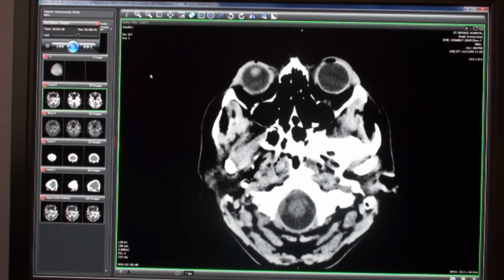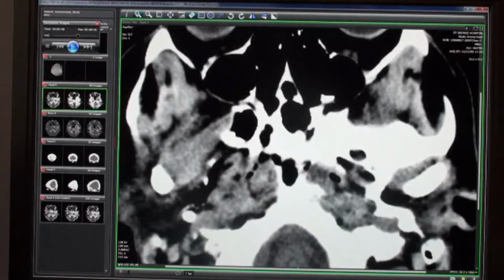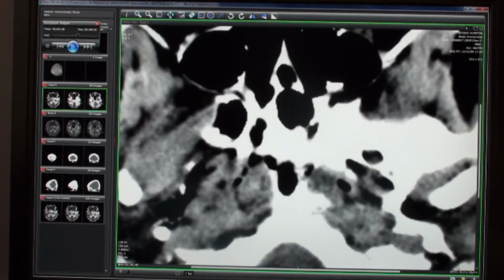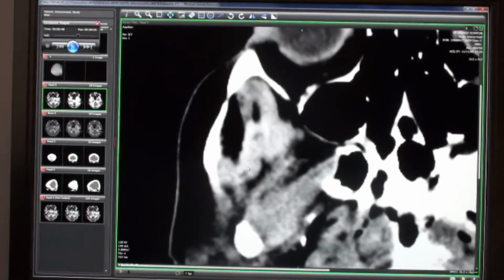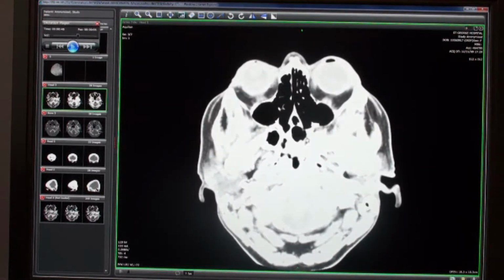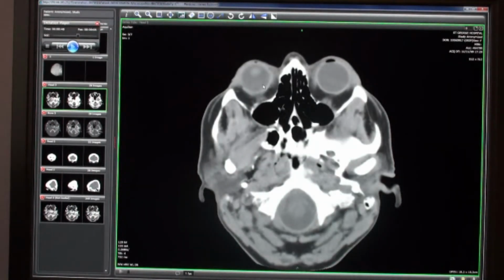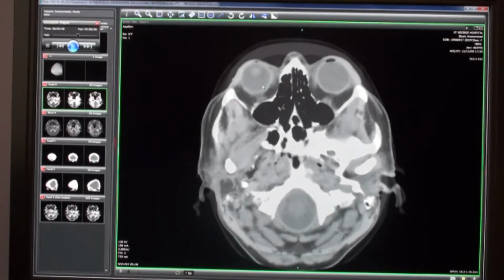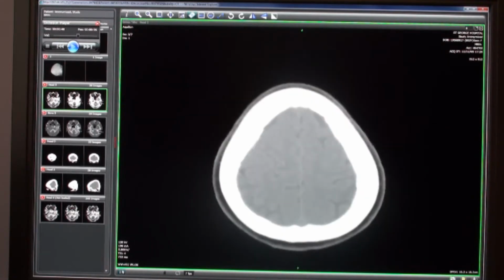Image manipulation tools include the ability to zoom. You can zoom in and out, and having done so, it's possible to pan around within the image to move it about. Window leveling is provided with this facility, and dragging and dropping the mouse for window width and level is also displayed. In a multi-image series such as with the CT or MRI, the Cine Loop feature will play these at a rate of 7 frames per second.